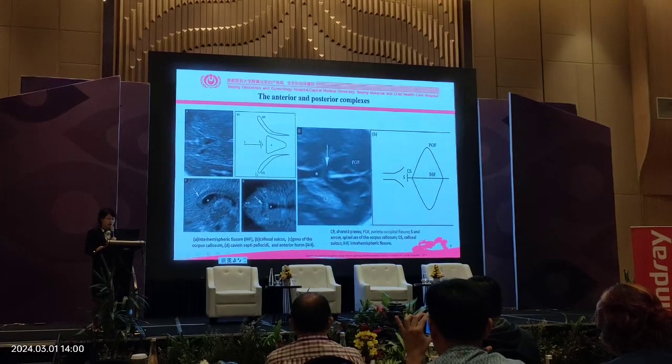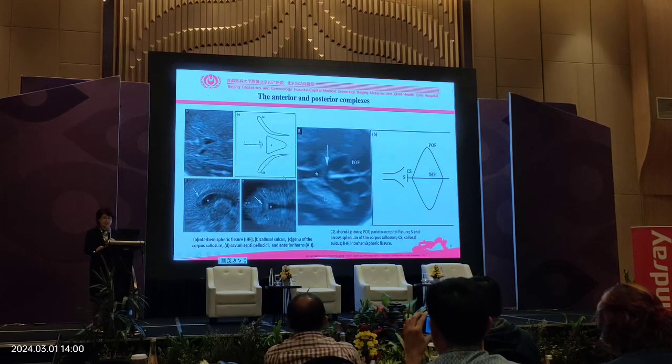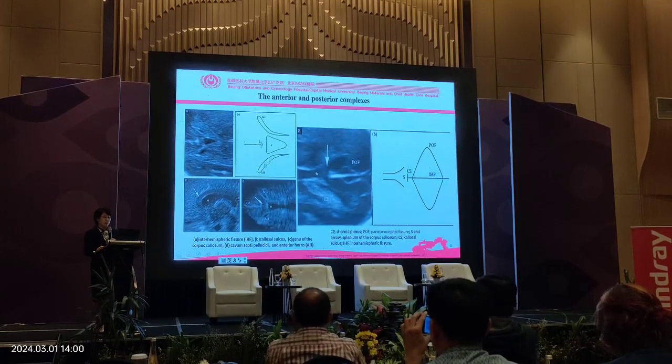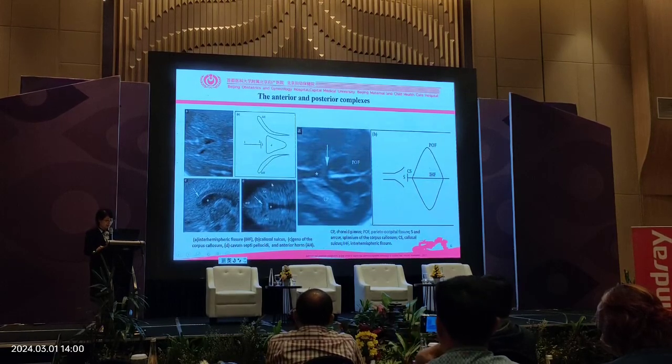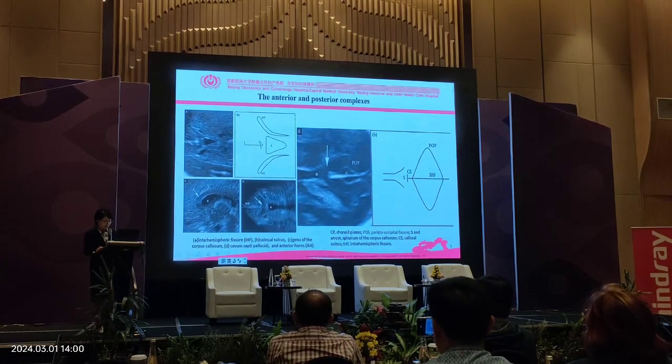In the axial ventricular plane, the anterior complex can be identified 98 to 100% of the time in the second and third trimester. And it's very important to visualize not only the anterior complex, but also structures located posteriorly. The posterior complex is also very important.